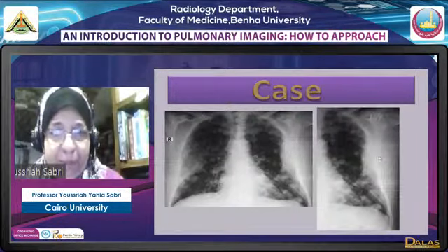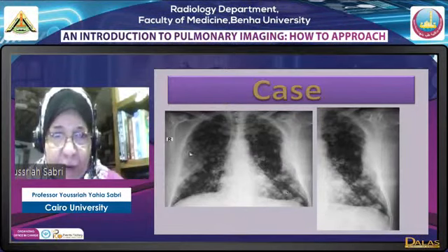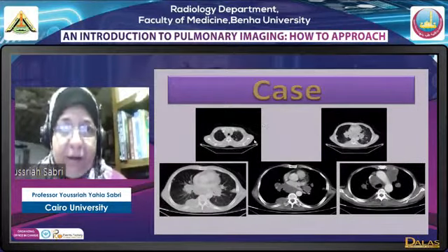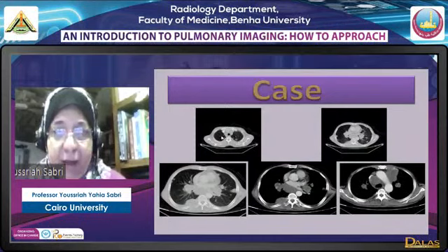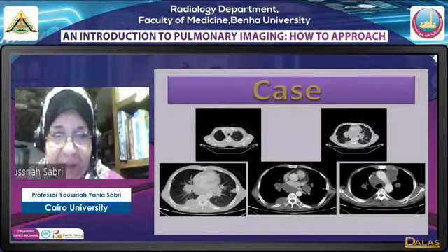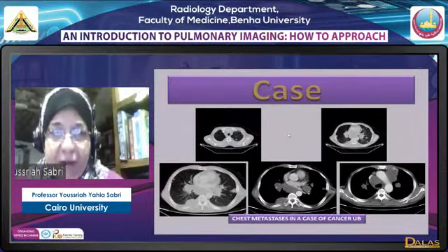Now here we have again a case of metastasis, multiple nodules with also affection of the chest wall. Again, this is metastasis. Nodules are well circumscribed, well defined lesions. Another case of metastasis, okay, CT with multiple well defined nodules, and there are also metastases in the mediastinum and in the chest wall. This was a case of urinary bladder carcinoma.